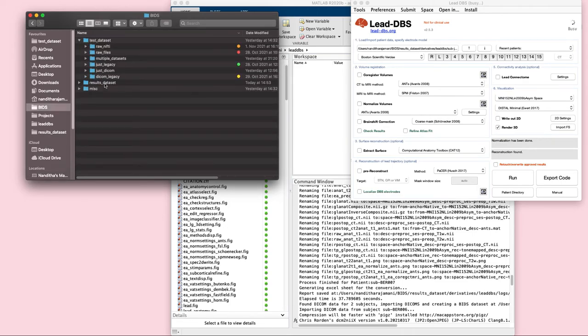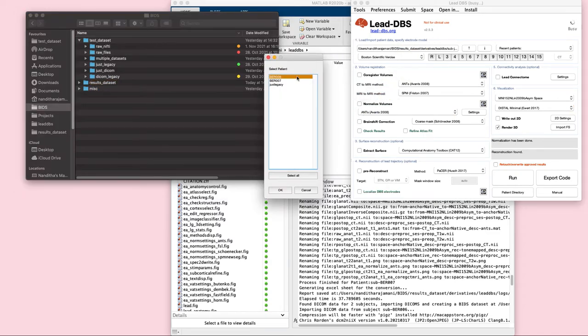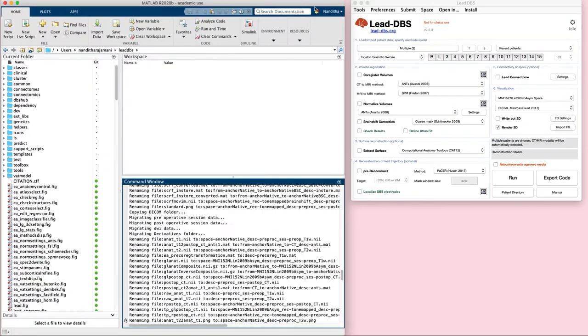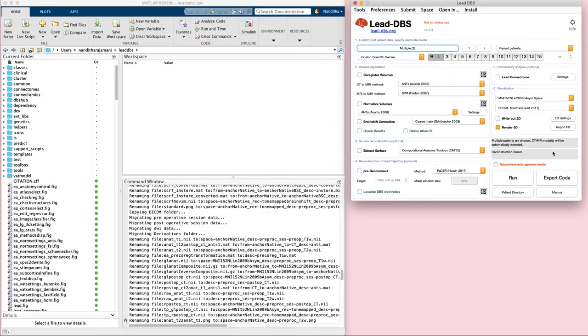We can now load this into Lead-DBS by dragging the output directory into Lead-DBS, and this should give you the patients to choose, and you can select them. So 2 patients have been loaded in, and multiple patients are chosen is the message given by Lead-DBS. So this should give a good overview of what you could do with your old data sets.